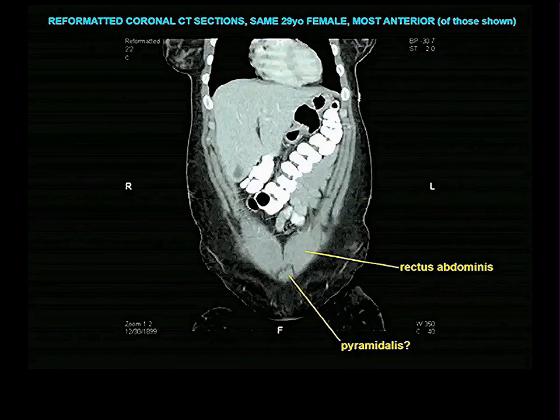These are going from anterior to posterior. I'm not going to go through all of these. I've only labeled a few things. Thought I'd show you this.